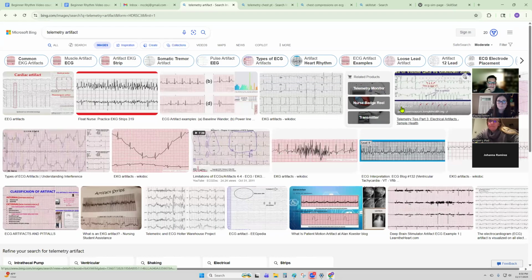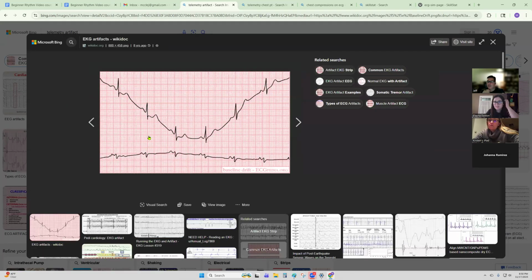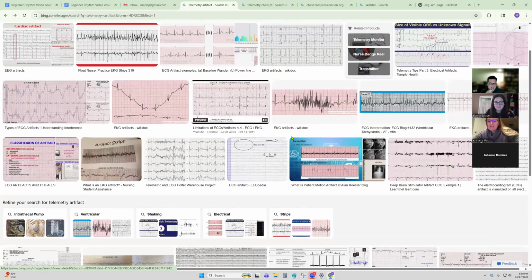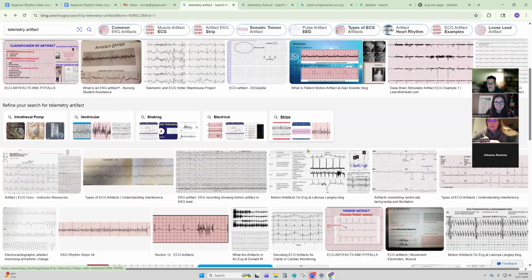And what else we got here? Like a wandering baseline someplace. Like this is kind of a wandering baseline. It just kind of goes all over the place. And that's just the stickers not sitting great on their chest. Or sitting on their stomach, like respiratory. Yes. Like breathing. The other day they said it was the air mattress. I'm like, oh, okay. Oh, that would suck.